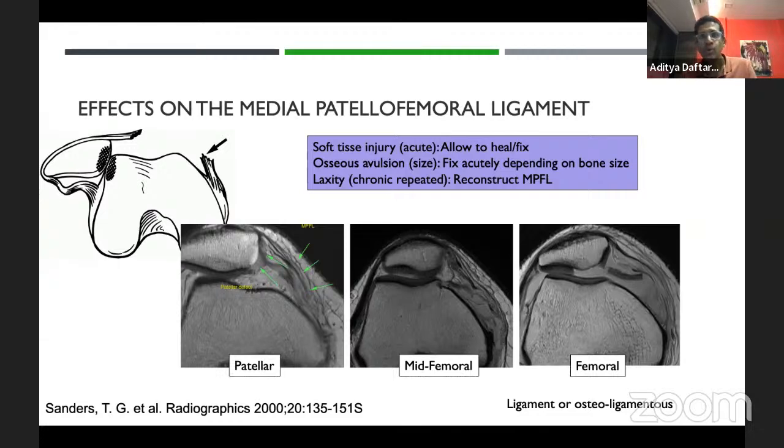If you have somebody who has OA and you're trying to see if the OA has gotten worse or better, again, routine proton density images are fine. The only time that you'll start thinking about whether you want to do a T2 map, and again, it's not mandatory, is if you're trying to say, is this hyaline cartilage that is replacing the gap? So if you do a regular proton density image, you'll see the gap is filled with tissue. Sometimes you'll see the signal in that tissue is also different from the adjacent cartilage.